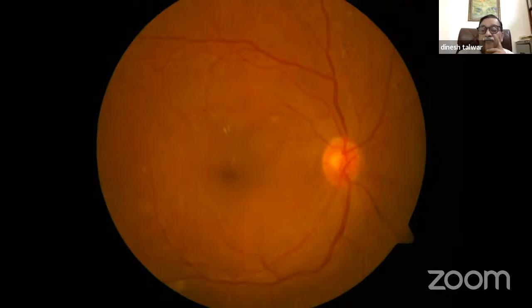Can a fluorescein angiography leak confirm clinically significant macular edema? There'll be leaks, capillary leaks, sir. So does that confirm? Supposing I give you a fluorescein angiography picture, and it shows some leaks. Does that confirm for you that this is a clinically significant diabetic macular edema? Likely to be. No. Fluorescein dye-leak maculopathy is a known entity. So you can have leaks on fluorescein angiography, but it may not be clinically significant.